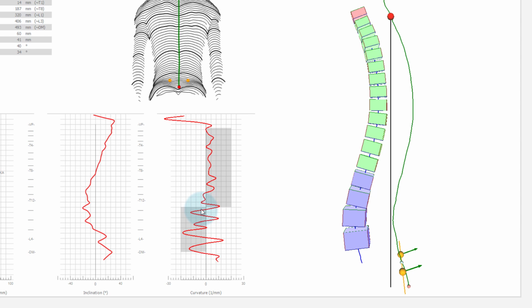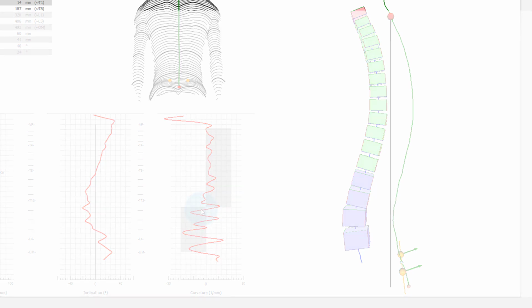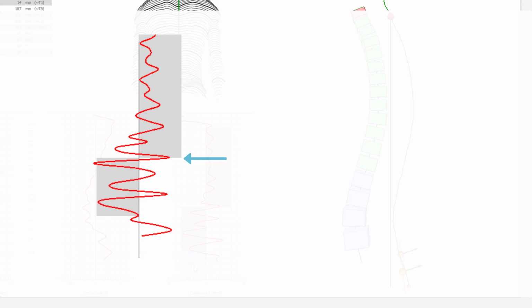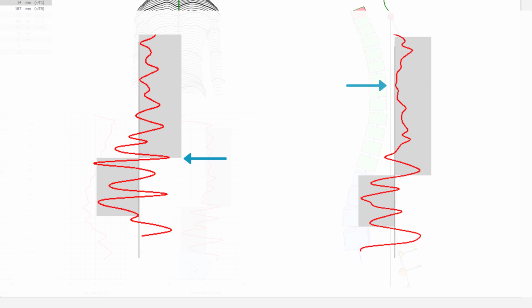But what can we look for in the concrete graphical course? The curvature should be positive, but is locally negative, so a deflection in the wrong direction. Or the deflection of the graph assumes the correct direction locally but exceeds the range of the other segment levels. In these cases, a muscular block may be expectable, but it may also justify a suspected diagnosis of a spondylolisthesis. Very unsteady courses may be indicative of segmental instability. Very low back and forth movement instead may indicate increased rigidity.